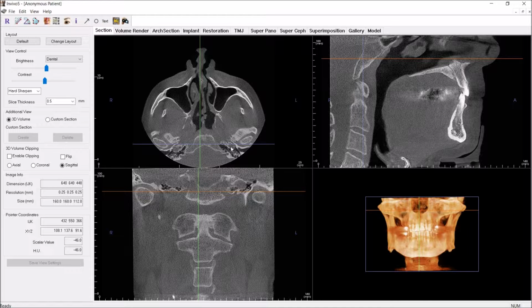That's the carotid artery, the internal carotid artery, as it's ascending through the base of the skull. And so this is a part of the skull base which is called the clivus, part of the occipital bone. Here we're seeing the TMJ, the condyle, and surrounding it is the part of the temporal bone.